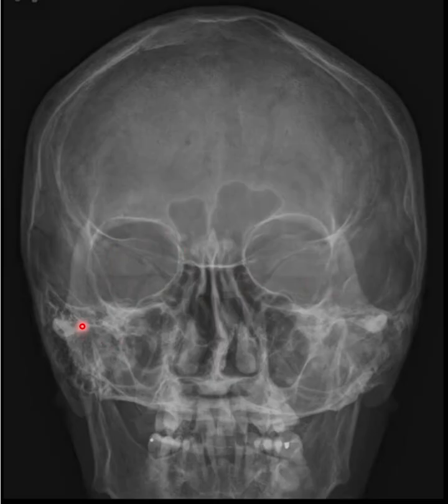In this image, the petrous ridges are a little lower than they should be. That tells me that the patient did not sufficiently flex their neck to place the OML perpendicular to the IR, or another error that could have been made that would cause this radiographic outcome would have been excessive angulation of the tube.